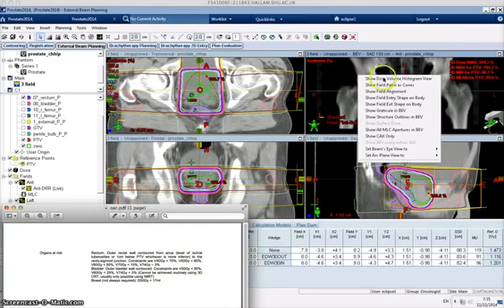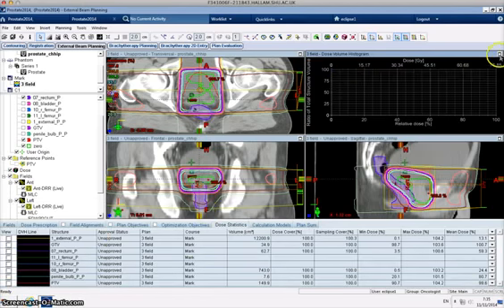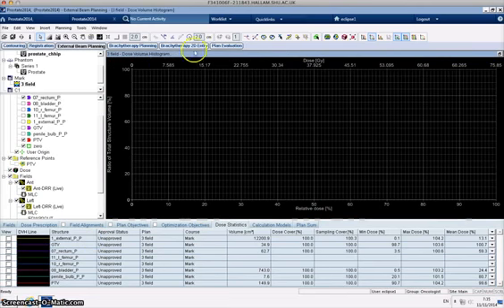So we're going to use this dose volume histogram, or DVH. So in the top right hand corner pane, right click, show dose volume histogram, and let's just turn everything off for the moment, and I'm just going to make that bigger. So we can see here that we've got the dose on this axis here and here, and then the percentage of the structure on this axis here. So this and this are exactly the same thing, but one's displayed in absolute dose, one's displayed in percentage dose, and we can see here that 100% is up to our 76 grey, and our ratio of total structure here.